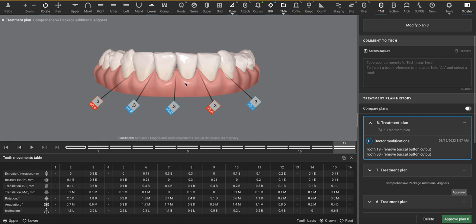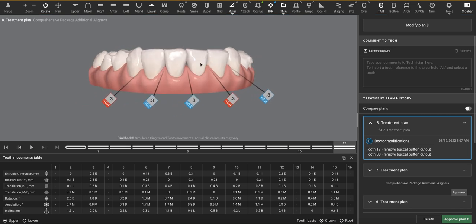Yes, we can use restorative methods too, but closing every black triangle with restorative methods is a great after-the-fact method. So what can we do ahead of time? Well, we know we want to do IPR here. Okay, so what I would say is let's plan on doing the lion's share of IPR here between 24 and 25 and not so much over here.